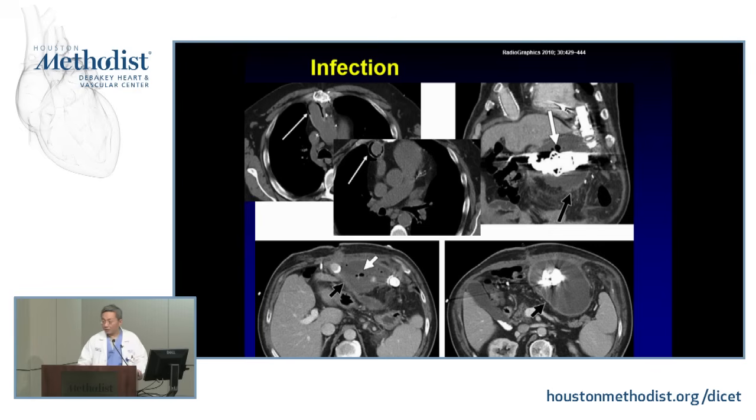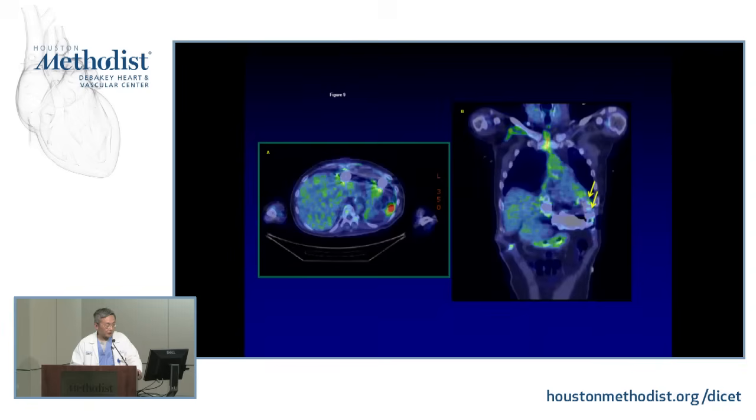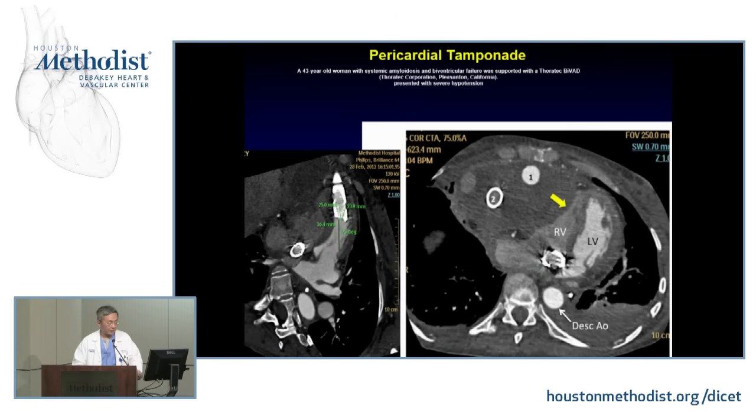Infection, fortunately, is not a very common occurrence. I don't believe we have too many cases. I can't find any example that we have here. This is obvious from some other centers, but with PET, I think this is your case, right, Mahwash, from Mayo Clinic, showing that PET will be our best way of diagnosing infection associated with VAD.